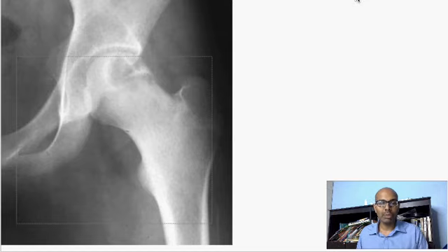Hi friends, welcome to part 2 of this reading of bone lesions on radiographs for NEET PG. So we have gone through quite a few benign tumors and benign lesions and how to go through them systematically to make a diagnosis of these lesions even if you don't have an idea in the exam. Right, let us look at the next lesion on this X-ray.